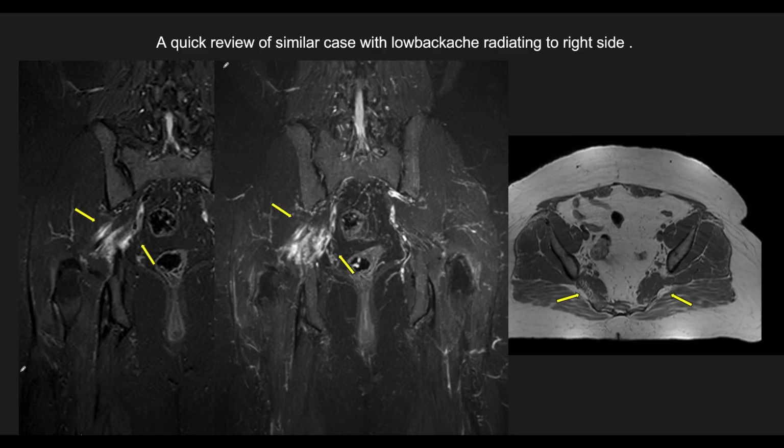Another companion case in a patient with right side radiculopathy: the sacroiliac joint, hip joint and lumbar spine were normal even in this case. You can definitely see the bulky hyperintense piriformis muscle with perineural hyperintensity. So this is a case of another right piriformis syndrome. Here you can appreciate the muscle atrophy in this case on the right side in T1 weighted imaging.